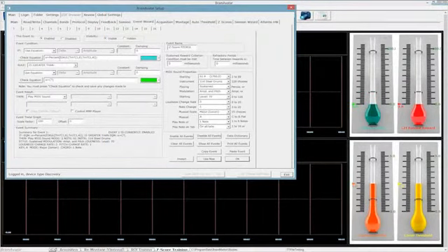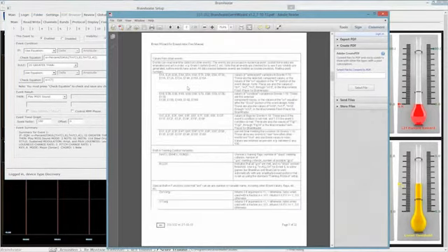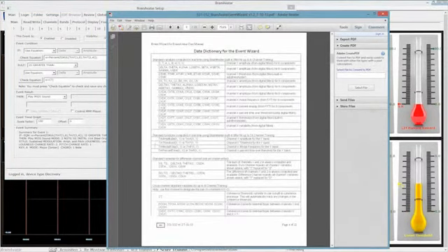So what we have here is %ZOKUL TRNT 1,8 TRNT 1,4. Let's find out what we're looking at. TRNT, or threshold: channel X threshold for channel Y band.